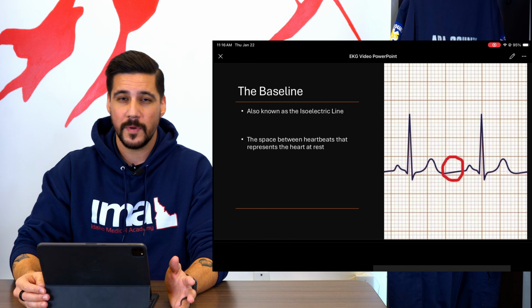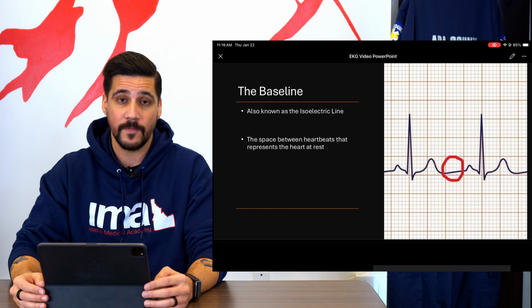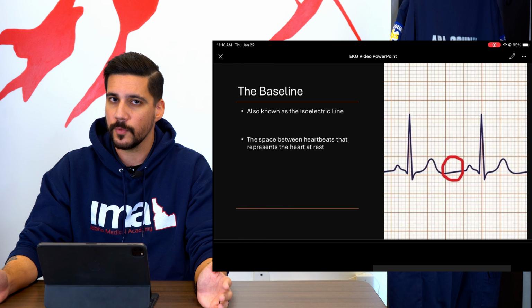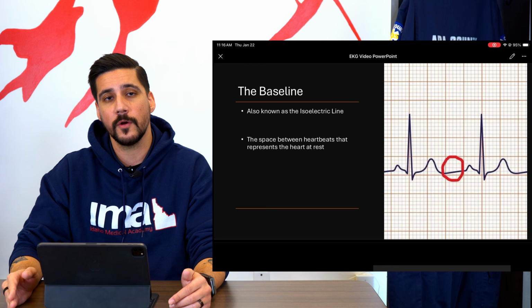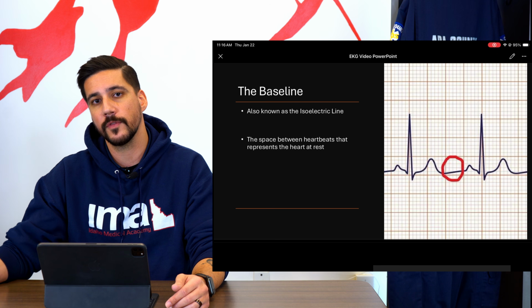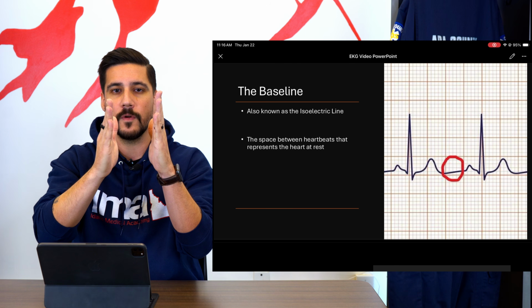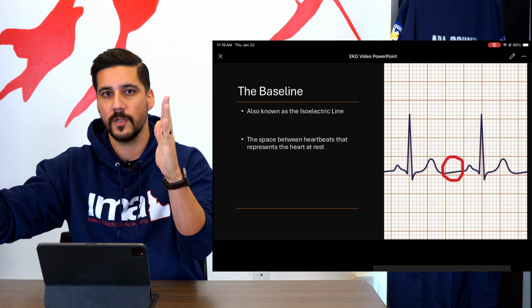And that's usually where seasoned providers start to identify, okay, fast, slow. If I'm seeing a total of 4 complexes on my strip, I can assume things are probably not going nearly as fast as they want. But typically what we look for is 300, 150, 100, 75, 60, 50, 40, 30. And that's just as those move big boxes away, right? So the complex stays: 300, 150, 100, 75, 60, 50, 40, 30, okay?